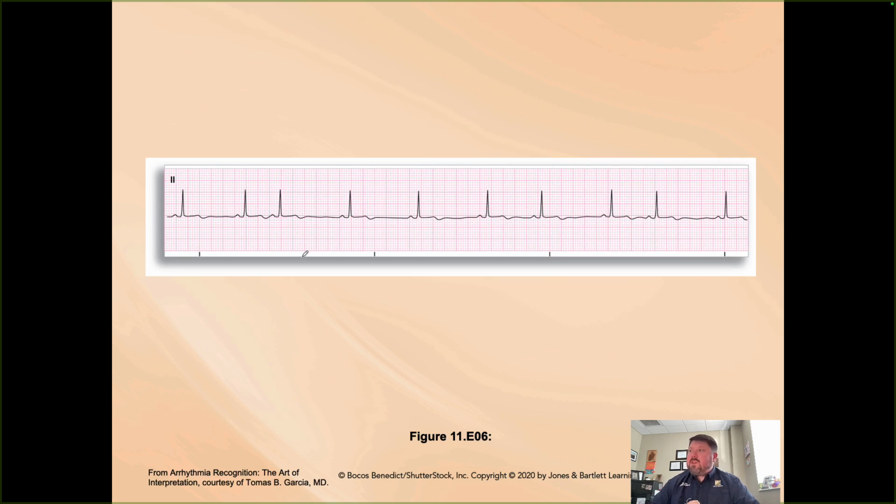Same thing here, not to be confused with an atrial fibrillation because of the way that the baseline looks a little weird, but you do have definitive P waves right here and right here and right here. So it is irregular. Rate is 60. PRIs look consistent. QRS looks consistent. So again, you've got a sinus arrhythmia.